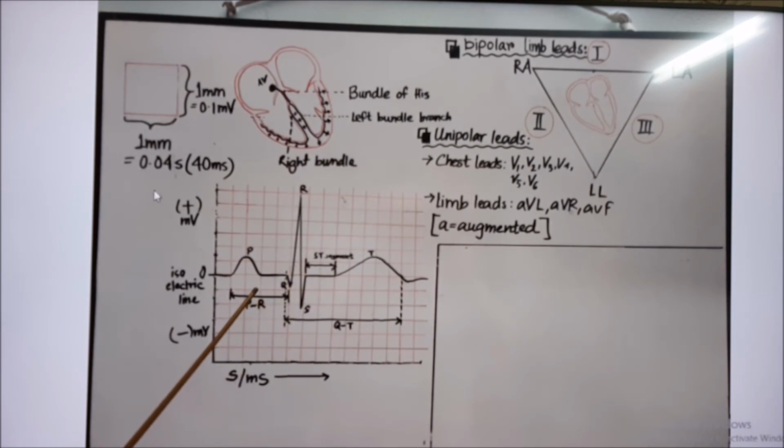Now, some important things. This is the PR interval. Sometimes it is called the PQ interval.